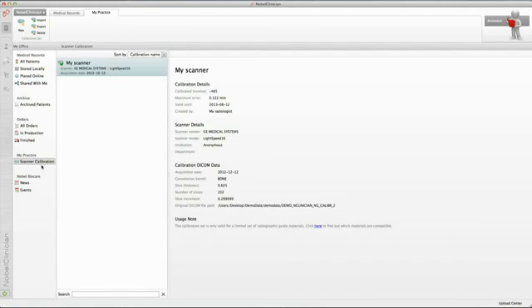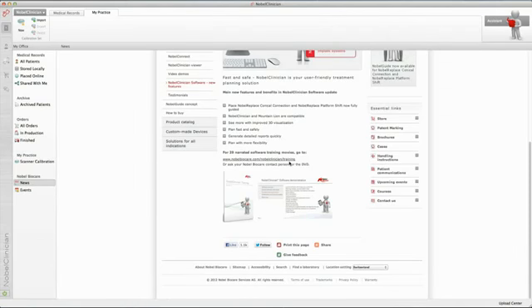Below the Nobel Biocare icon, you will find the News and Events icon, showing you information regarding these topics. In the News section, you can also find an online link to these training movies. Enter this link in an internet browser to access the movies online.